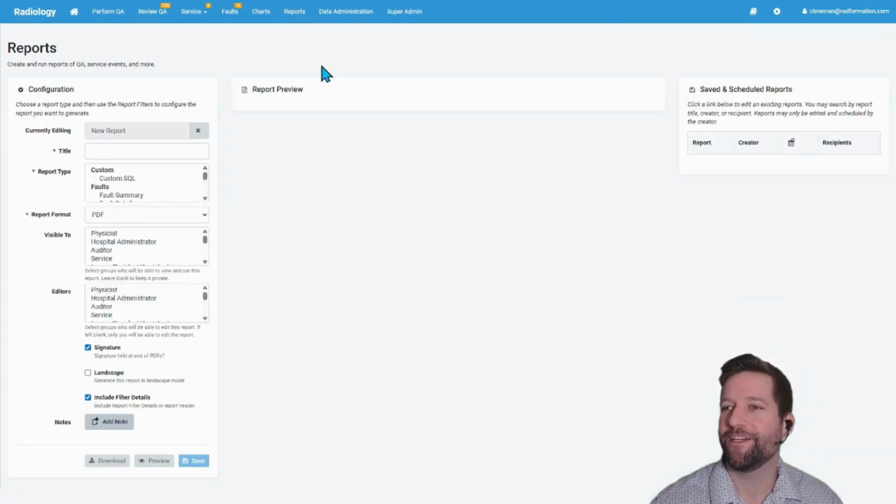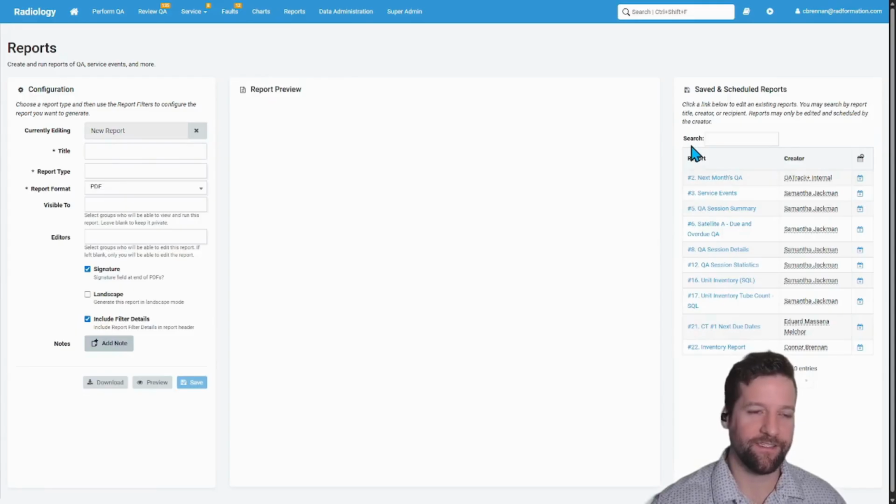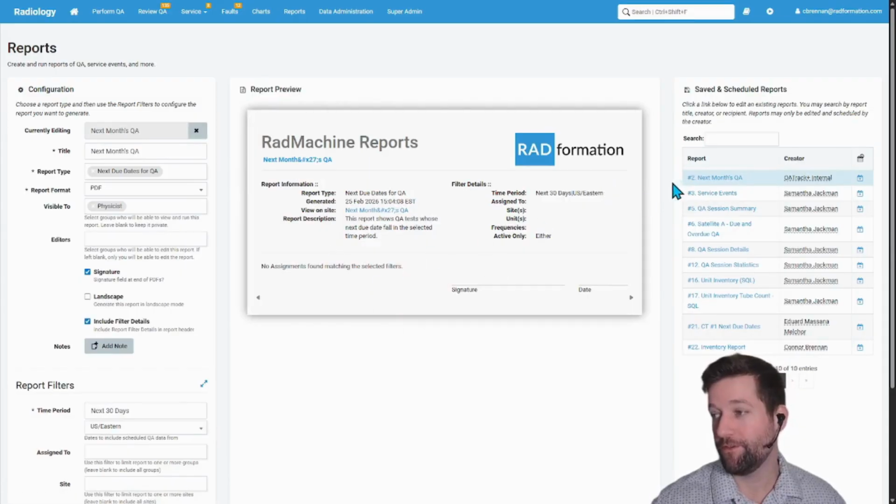And then finally, we've got reports. We've got a bunch of custom built ones. These can be scheduled to be sent out to whoever you would like at whatever frequency you would like. I can see a report of, well, here's what I have. Cool, I don't have anything coming up in the next month. Great. But normally I would see a list of what I need to do.